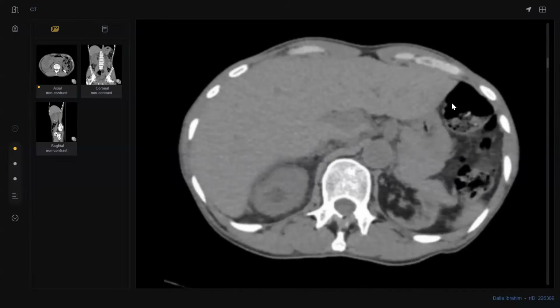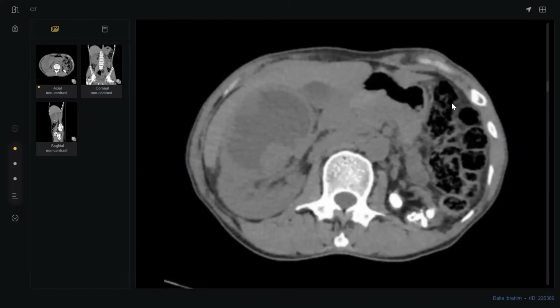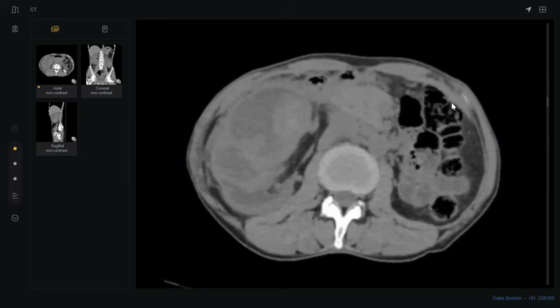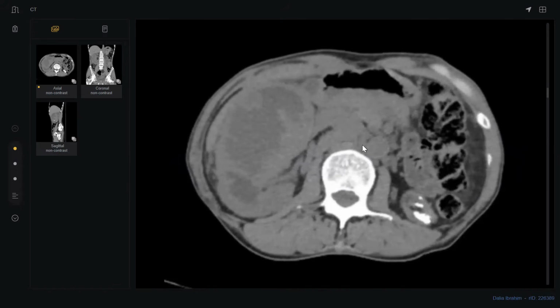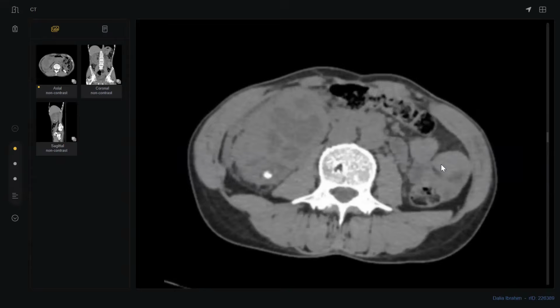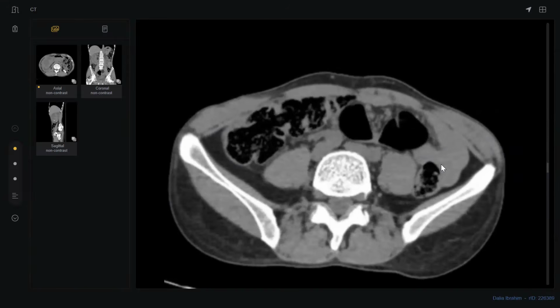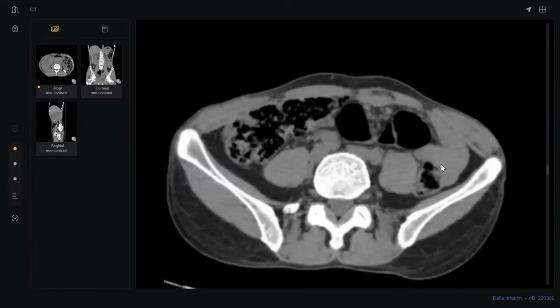In this non-contrast study, I couldn't appreciate any free fluid collection. However, I can see there is some soft tissue component seen within the right kidney of the dilated calyces or cystic lesions. I correlate with the patient history, and in my routine practice, I will check the post-contrast study to see any enhancing mass.